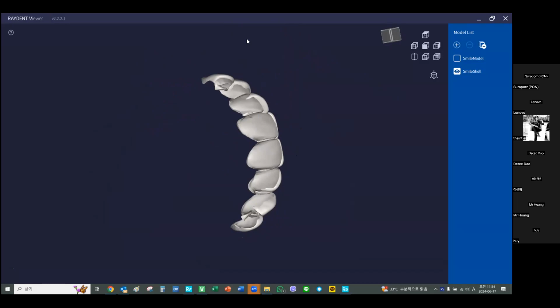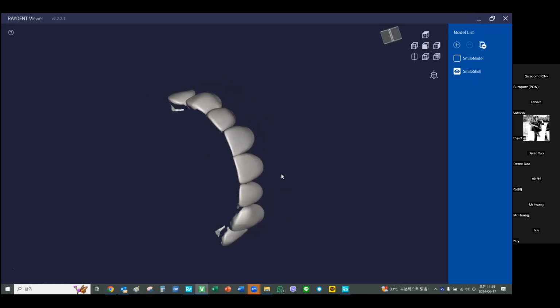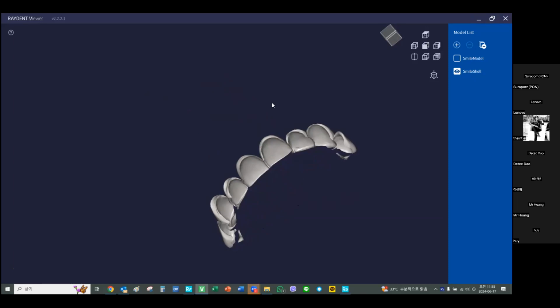Maintenance or cleaning? Not really. Just make sure that you don't drop to the floor. Just clean on the camera so that the camera is clear. Just clean the lens with like a lens sweeper, like what I have it here. You know when you clean your glasses, like clean the lens. Think it as like a camera, okay?